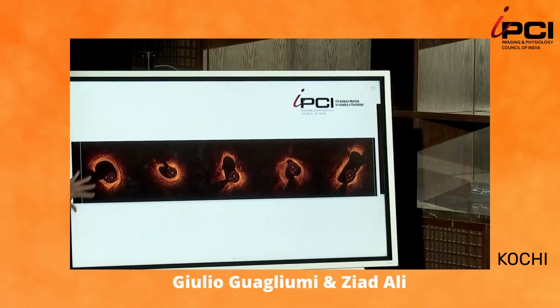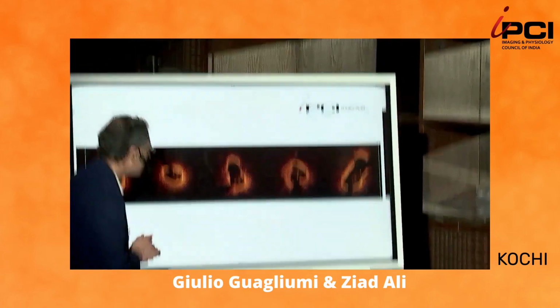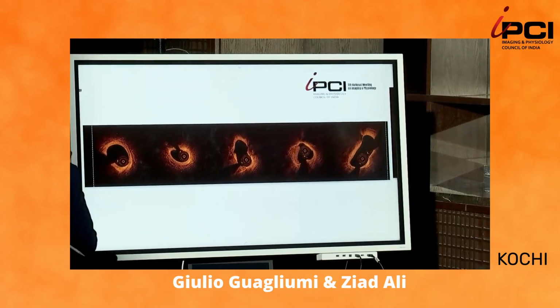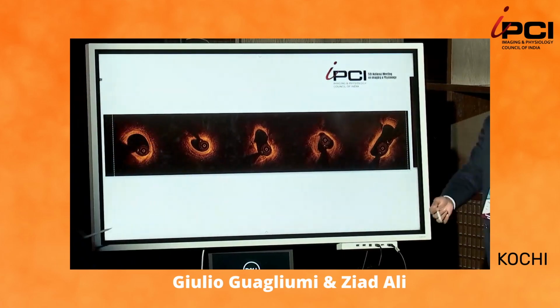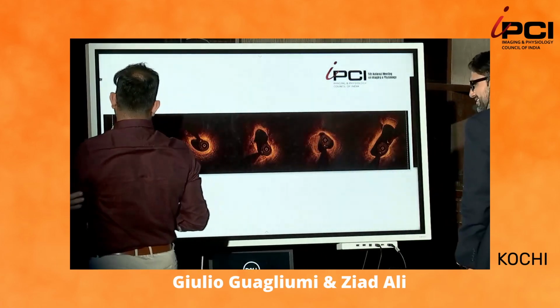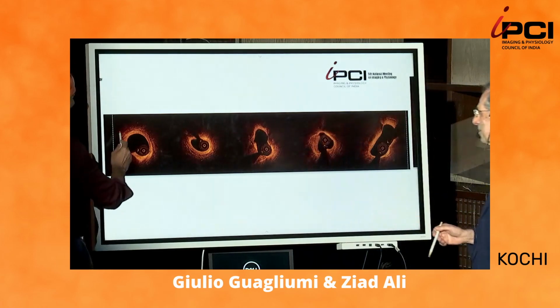Absolutely. Let's talk about this type of images where you have multiple components. Is there any volunteer that wanted to come to the smart screen to tell us where are the essential components? All right, come. Arun, you are biased. We are taking an expert guy. That is not in the rules normally.